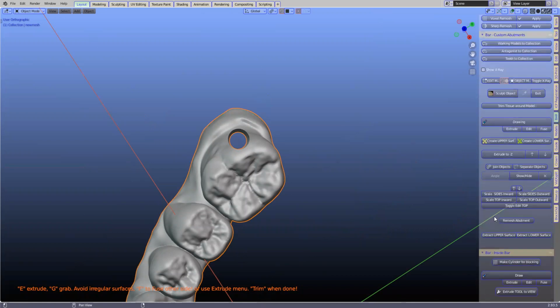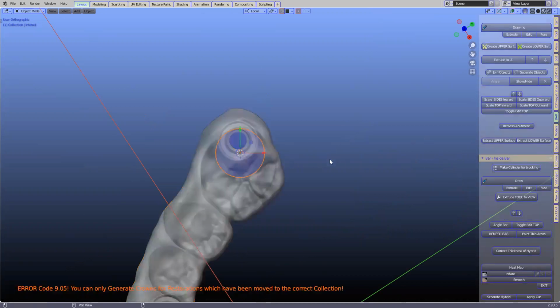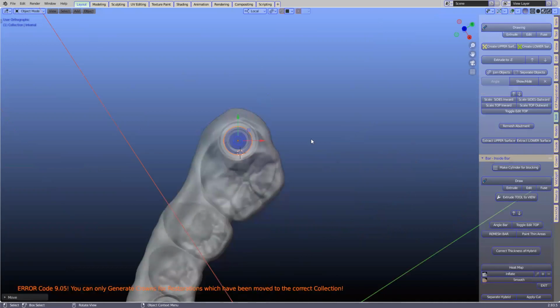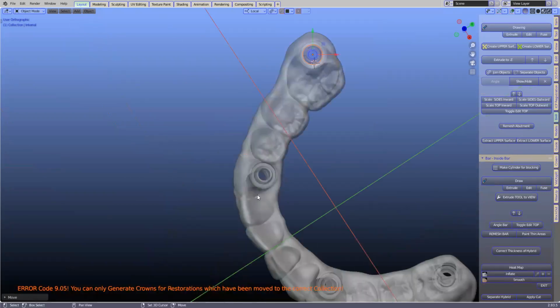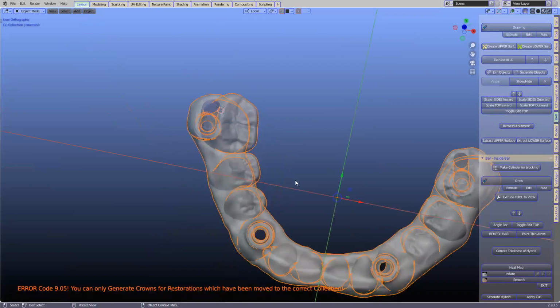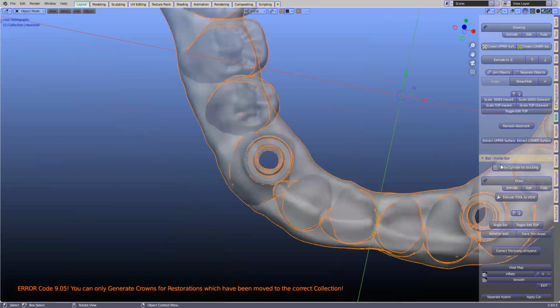So first thing, you want to protect these holes. So you put these cylinders into it. It's extremely important. Otherwise, they're going to block the inner walls of the hole? You're not so concerned about anything else? Yeah, just the screw channel.